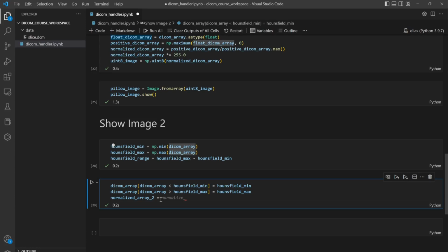So the idea here is to take the array and do minus the minimum, sorry. So if you have like 1 minus, and then here you have -1, for example, this means that you will have equal 1 plus 1. This is what it means. 1 minus -1 should be 1 plus 1. This is how it looks.